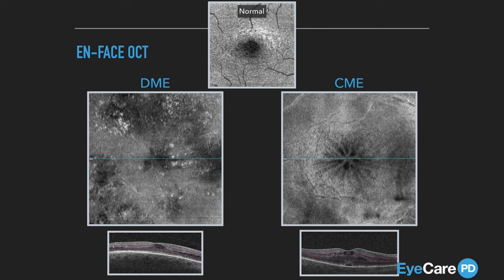The other important aspect as to why I highlight this is because when you're looking en face, you need to understand which en face cut you're looking at. The en face cut in this case is between these segmentation lines, between the purple ones. That's what we call a slab. This is the slab you're looking at. Again, between the two purple lines, that's the slab you're looking at.